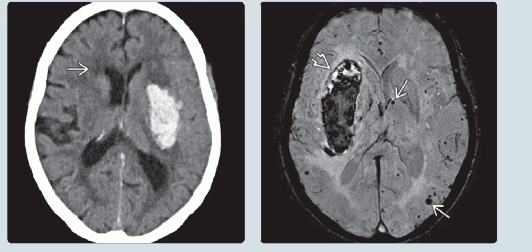Left is the axial CT scan in a 61-year-old female with a history of hypertension, and it shows the classic appearance of a left basal ganglia hemorrhage involving the putamen and external capsule, that is the striatocapsular region. Note the additional areas of periventricular hypodensity likely related to chronic small vessel ischemia.